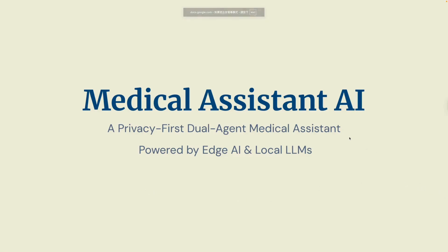Okay, hello everyone. Welcome to the demo of our project, the Medical Assistant AI. This is a locally deployed dual agent system designed to bridge the gap between complex medical imagery and patient understanding.